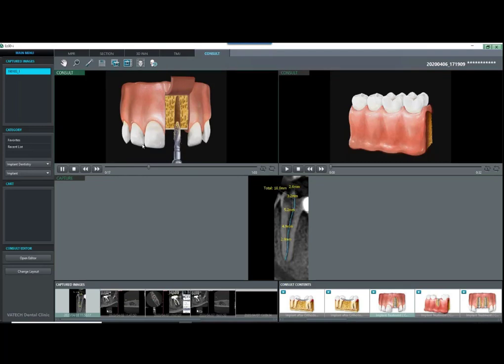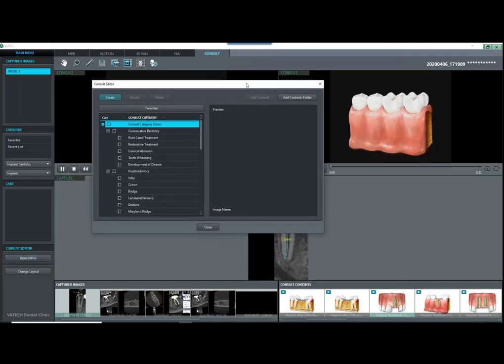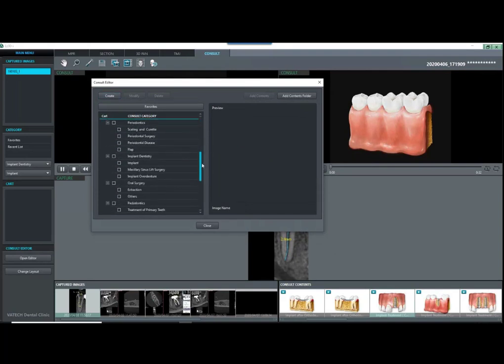That's very cool. Yeah, you can use any standard video format when you record your videos. Whether you're recording it yourself or you have another source of videos, you can import them, make your own categories, all from the editor here on the left. So it's really customizable, which is nice. Right, and we do have a complete video in our video library of how to add those implants. You can see I've added a couple down here, different videos where I've added on how to do that. So you can go through, and if you want to hide different videos, if you're not worried about certain specialties, you can hide those so you don't see them in the full list.